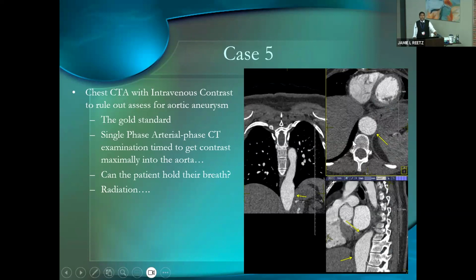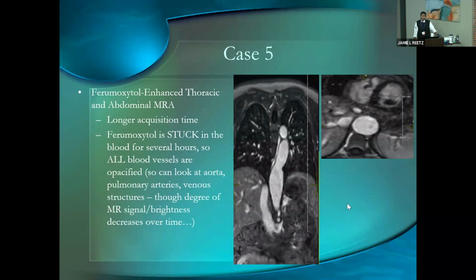You can see there is aneurysmal dilatation of the descending thoracic aorta going into the abdominal aorta here. Now, she ended up being pregnant, and with Marfan syndrome, there's always a concern: is the aneurysm getting bigger in pregnancy? Now there's increased pressure on the vascular system to account for the pregnancy. We did it with ferumoxytol. Look, the pictures are pretty good.